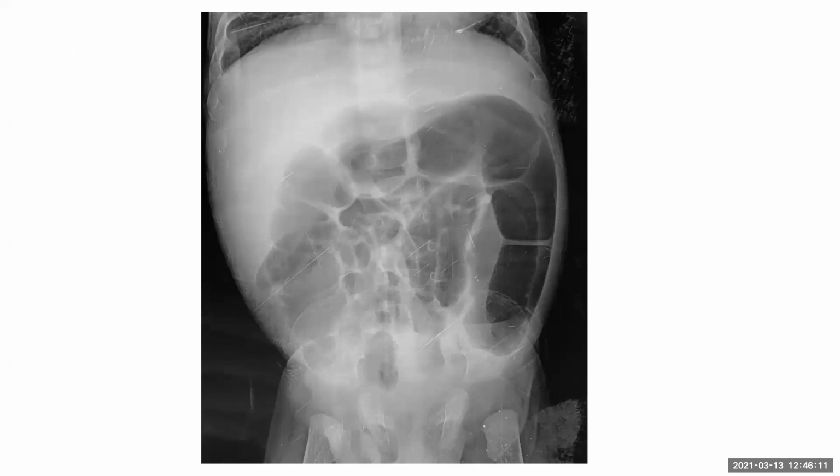So I have been provided with an abdominal radiograph of a crying infant with a distended abdomen, and the striking abnormality is the distended bowel loops. I can appreciate that some small bowel loops are also distended, which are present in the center of the abdomen, and the large bowel also appears to be distended.